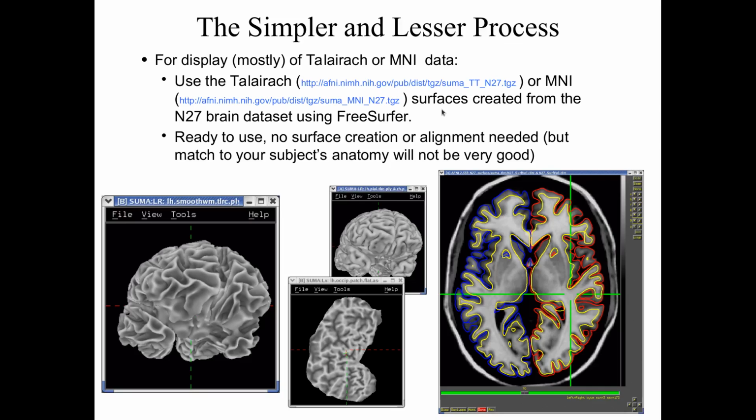These data sets were put into FreeSurfer's recon-all program, and then we translated them into NIfTI and standard meshes and good things like that. You can download those from the website. Probably there's actually an HTTPS on each of these web links, just something to note. Then we'll discuss projecting volumetric data onto the surface. Sometimes people like these flat maps like this, or other different types of representation.